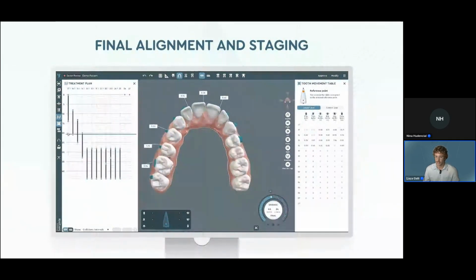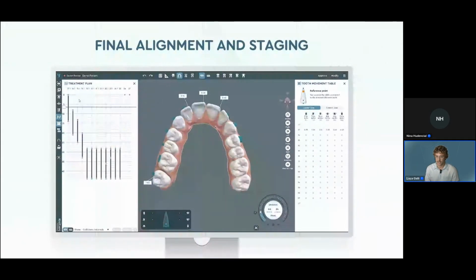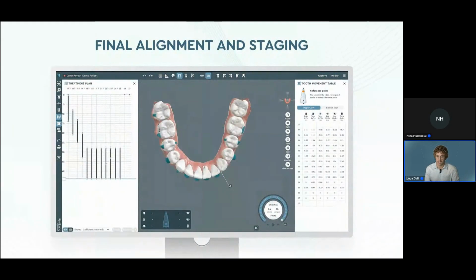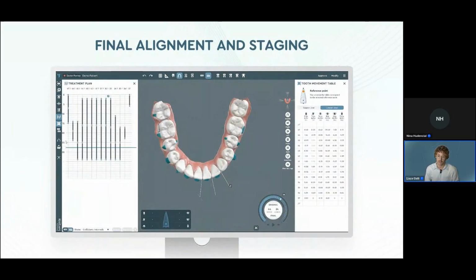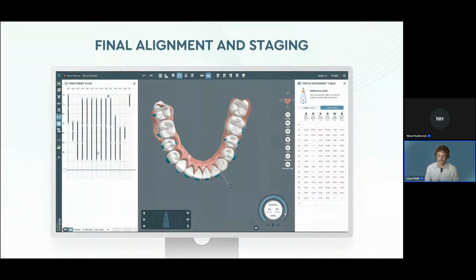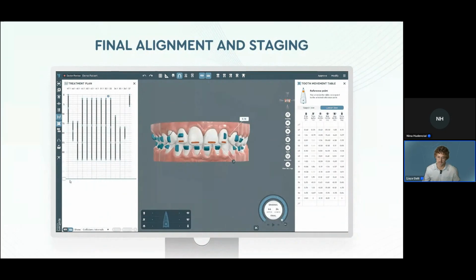And in the occlusal view, you'll notice we're expanding and distalizing at the same time. In this case, we chose to combine them because the upper first molar is slightly rotated, and this gives us a much better surface to drive the distalization without unnecessarily prolonging the treatment plan. On the lower arch, we protrude and intrude the lower incisors first, and only after that do we address the torque. Basically, a mild round-tripping approach to keep things controlled and avoid unwanted interferences early on.